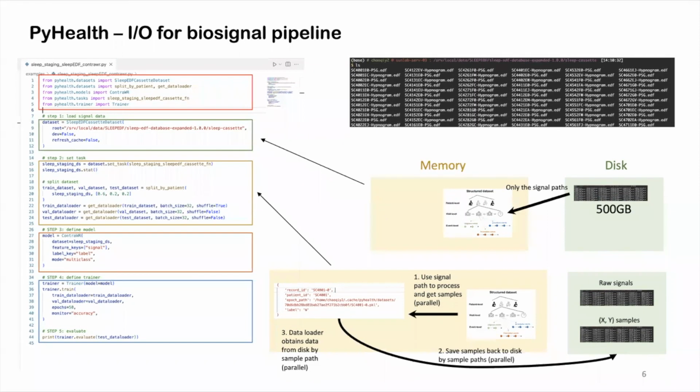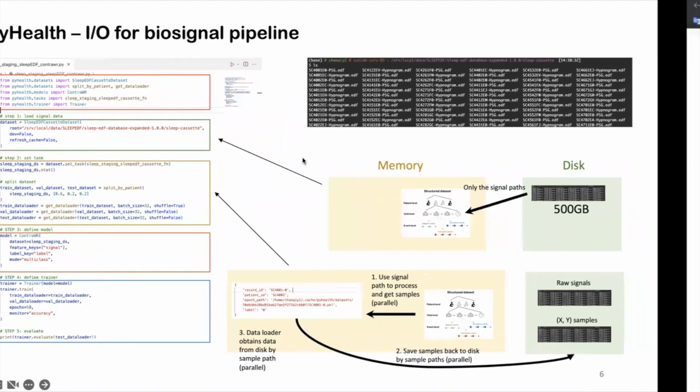You make a prediction, this is awake, right? Then you should tell the, I mean, one thing is what George asked, can we associate with the original patient? Yes. Then we should also associate with the timestamp, right? At this time interval, this is the stage of the sleep. Oh yeah, I think everything will be very clear when I show the pipelines step by step.